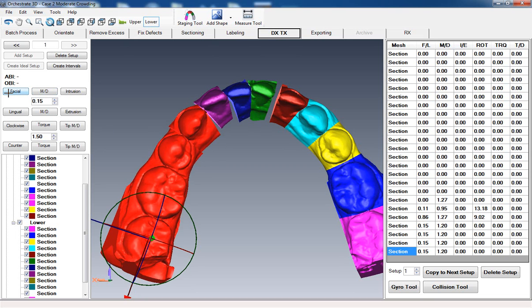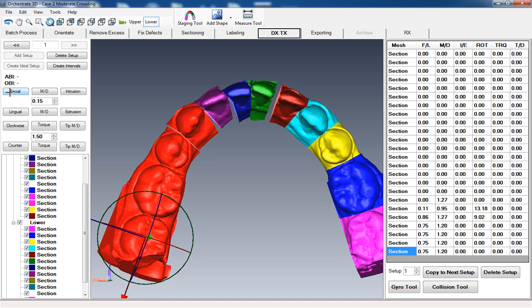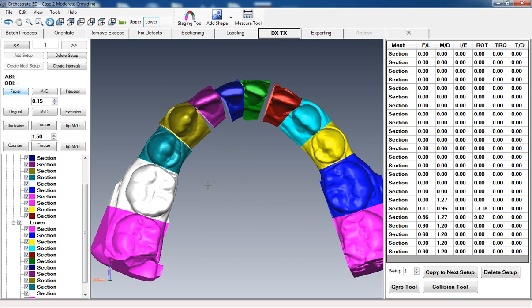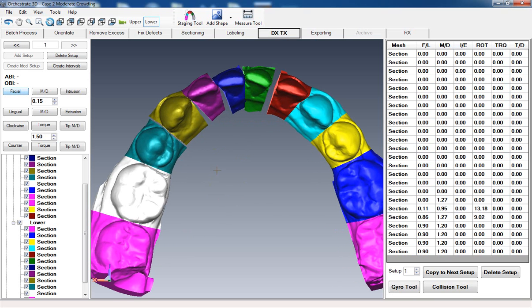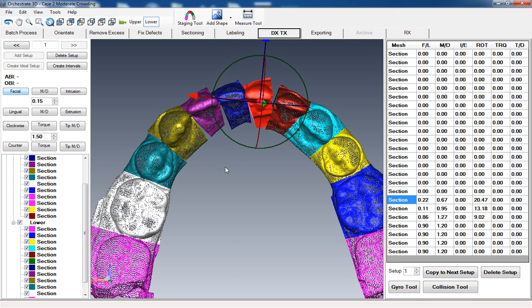Okay. Now I'm going to bring these teeth out facially. So we get that cuspid to the approximate location next to the lateral there. Okay, and again, we take this to what I call 90% corrected. Now we're going to move to the lower right central, and first thing we're going to do is rotate. And now we're going to move distal until there's ever so slight space there.